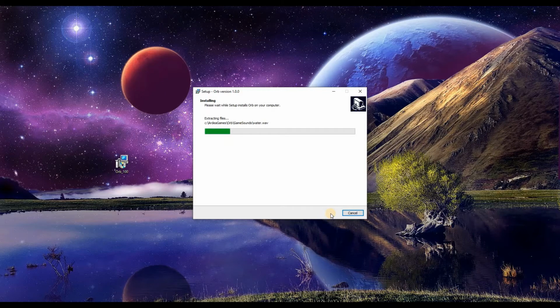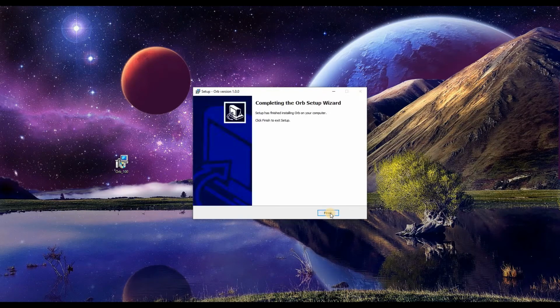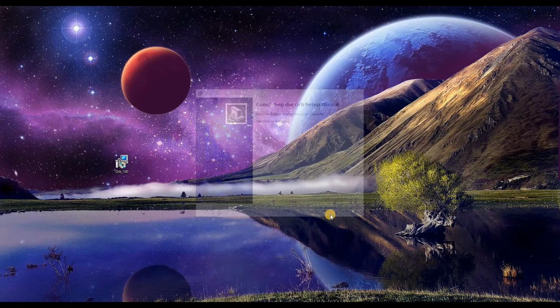So it does its thing. It loads, it installs. You take this opportunity to find some gratitude for something in your life. Perhaps just gratitude for the fact that you can breathe, or the fact that you are here alive. You find gratitude for the fact that you connected to gratitude. Well, there we go, enough gratitude. We can go to finish.